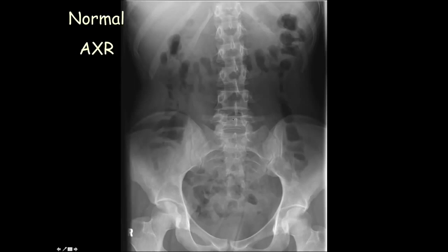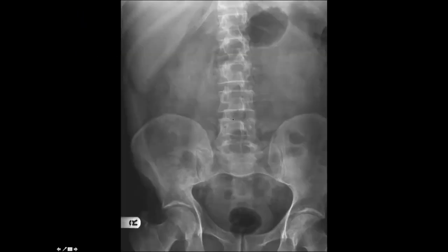Moving on to the next. This is another abdominal X-ray, but here, if you remember the last one, not much gas in the ascending or transverse colon. In fact, if anything, it looks more mottled, and this is just fecal residue, and again very much normal. So that's where the colon is, and you can see some fecal residue all the way.